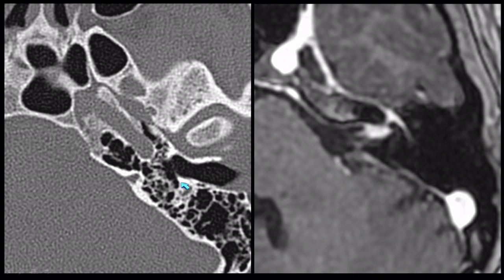So on imaging, we see these very well, and we know that there's some enhancement that normally happens around it. So we're frequently trying to figure out, is there too much enhancement along the 7th nerve itself? Here's that horizontal segment of the carotid, and we see those little fibers of the greater superficial petrosal. They're nicely enhancing here in this pathologic case. There's always a break here at the horizontal segment of the carotid. That's where those sympathetic fibers from the carotid join the parasympathetic fibers from 7, and together they form that pterygoid or Vidian canal going anteriorly.